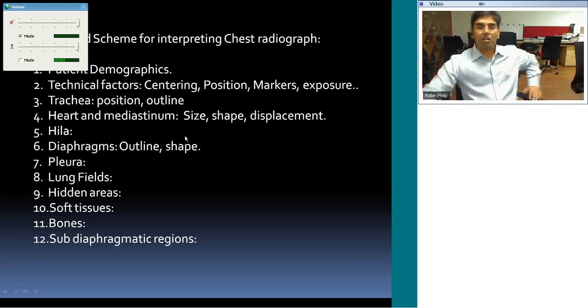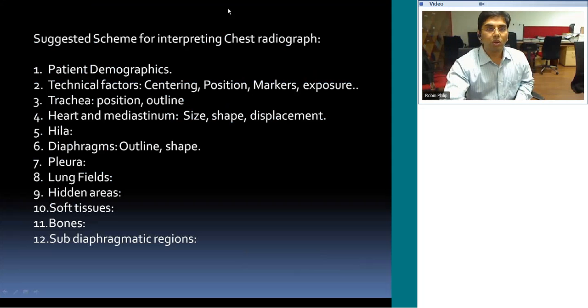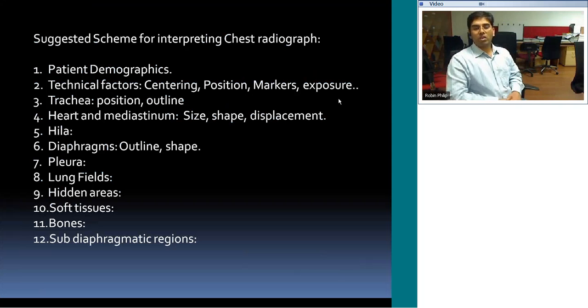The chest radiograph is one of the frequently ordered radiographic examinations in children as well as adults. Hence, accurate interpretation is very important for administering appropriate therapy. There is a systematic way of interpreting the chest X-ray. It goes like this. This is a suggested scheme.